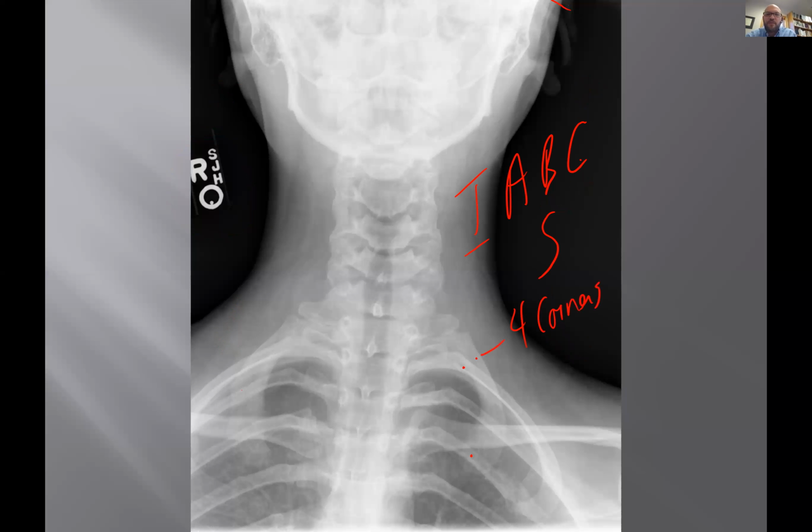And when you look at the soft tissues there, that's when you're going to see it. You're going to say, okay, I'm going to look at the upper lobes of the lung and make sure that I'm not seeing anything there. And boy, when you start looking up there, you'll catch that rib fracture. So yeah, I think it's a subacute rib fracture. Good pickup.